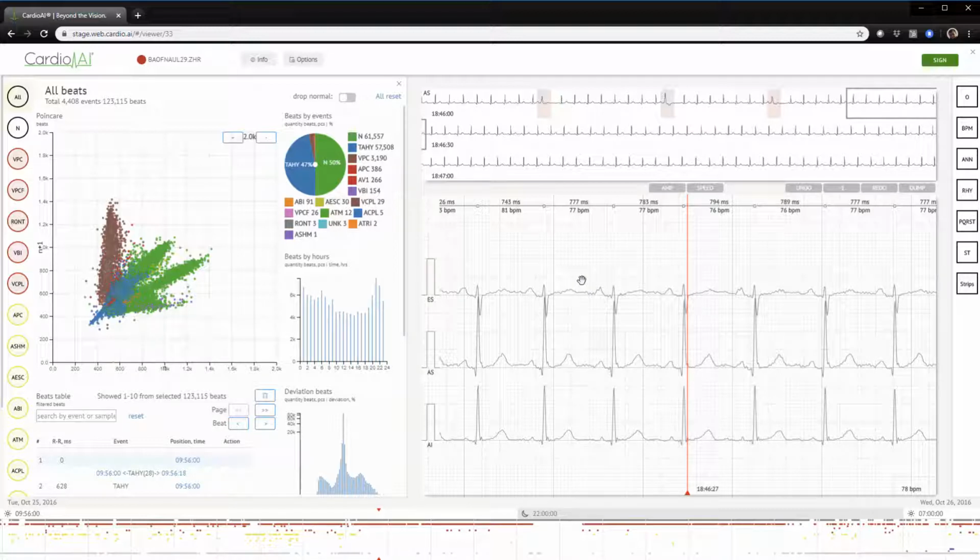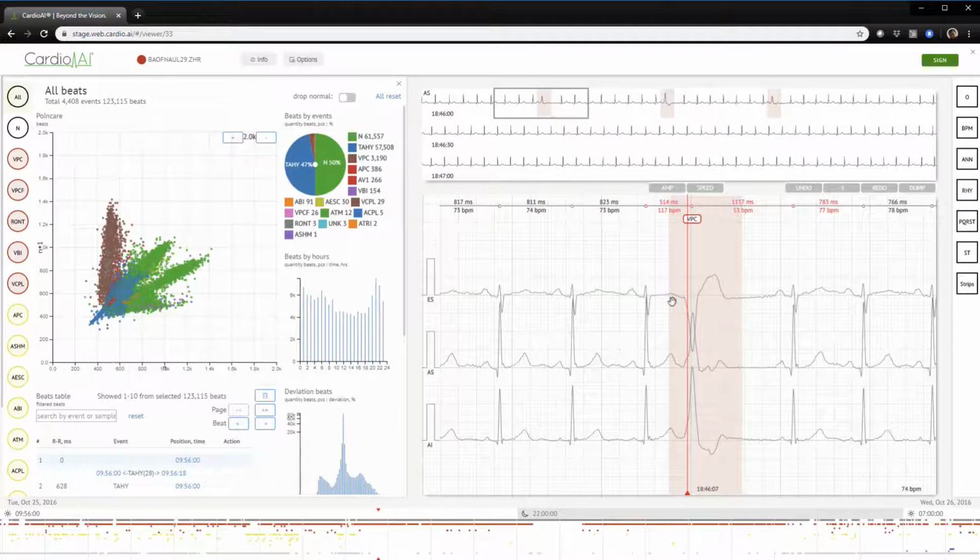The main difference from most software on the market is that the initial cleanup phase is done by a powerful AI system which understands a large number of classes of different abnormalities, so you don't have to go through the templates manually. That way, we want to grow your confidence that an AI-augmented technician is much less likely to miss something of importance.